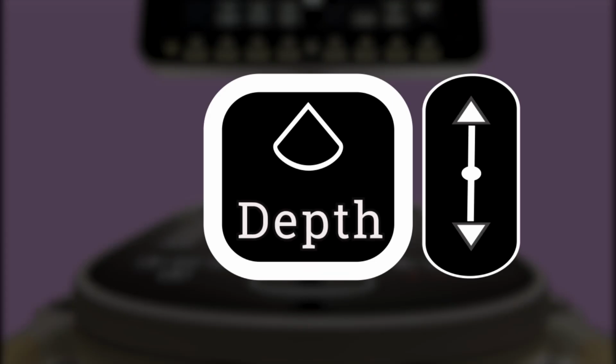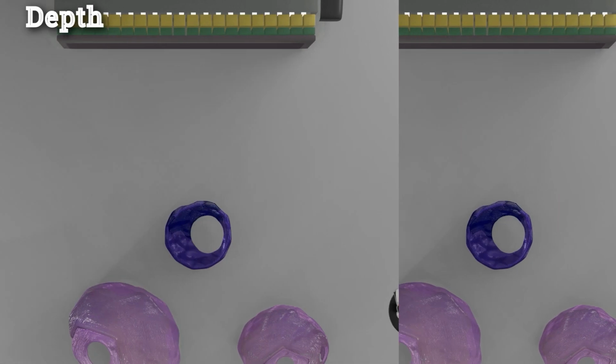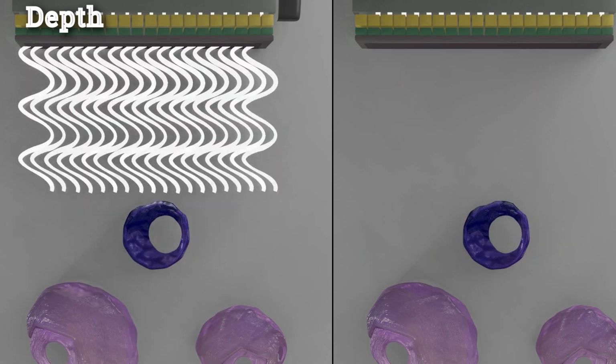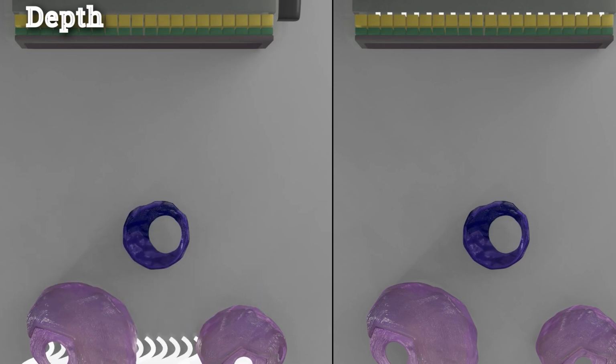Let's take a deeper look at the ultrasound machine and its knobs. Knobology. Depth. This setting controls the vertical depth of the field of view. We need to set depth to the target structure for optimal spatial resolution. Increasing the depth allows deeper tissue interrogation at a cost.